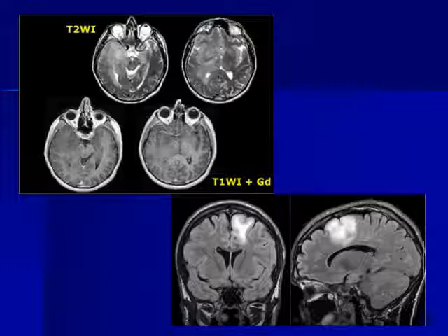It infiltrates the gray matter, causes expansion like this, ill definition of its border, the edema is minimal, and here as you see there is expansion of the affected gyrus. This is the clue that allows us to say that it is neoplastic, not just an inflammatory or vascular insult.